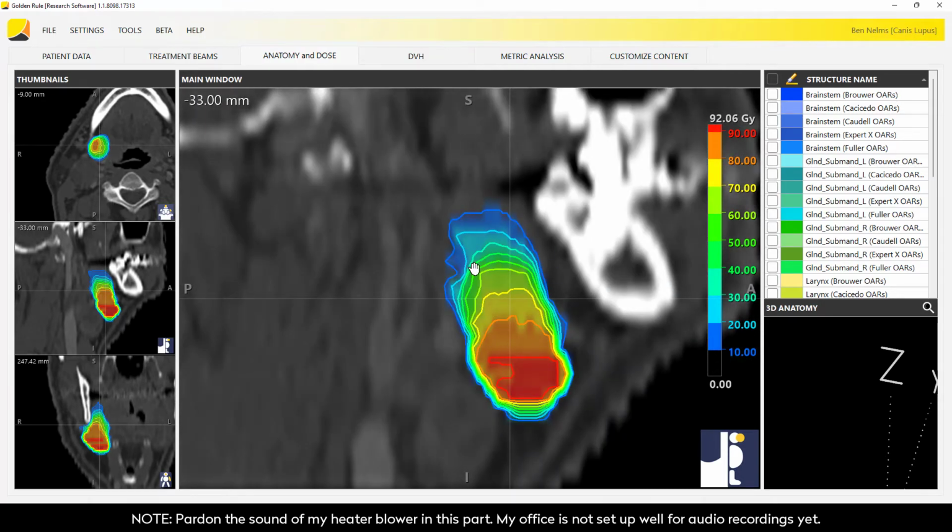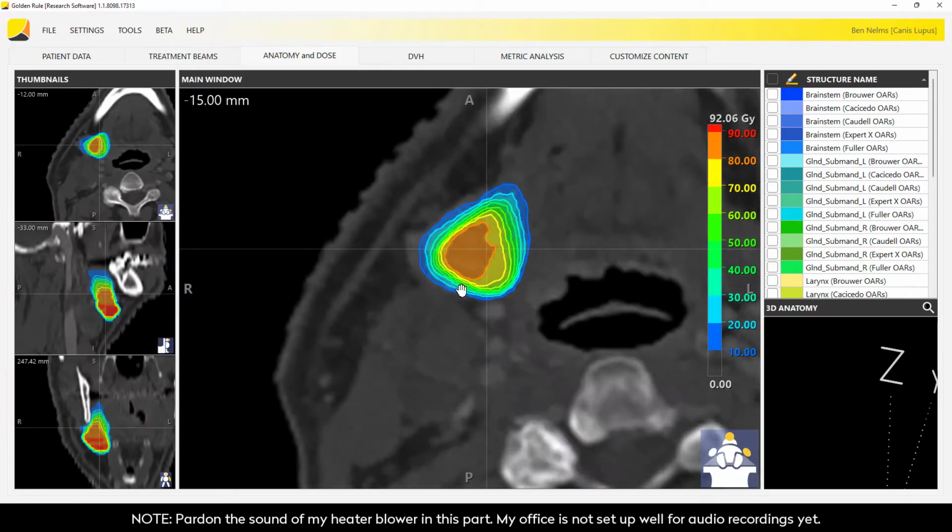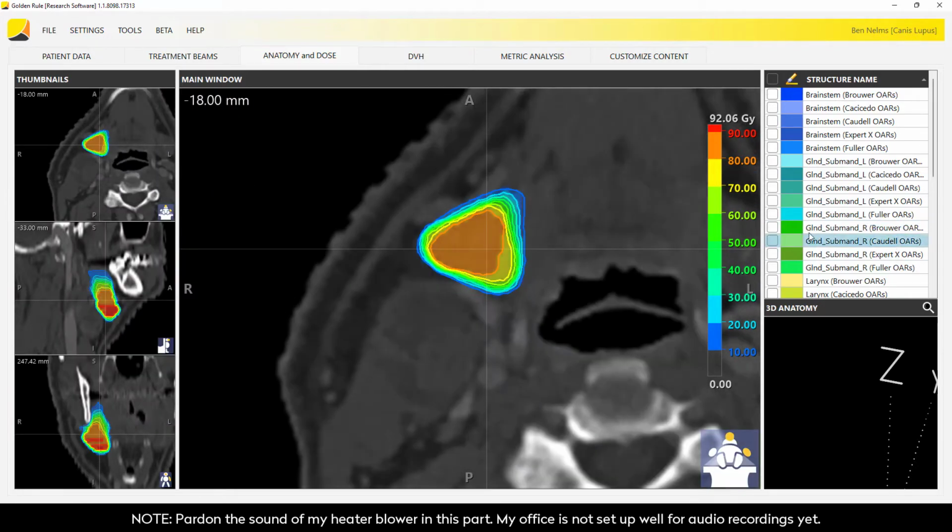It's a large region of disagreement, and it's in this direction. So this is the area we should be talking about. Let's take a look at our experts. Let's turn them all on.